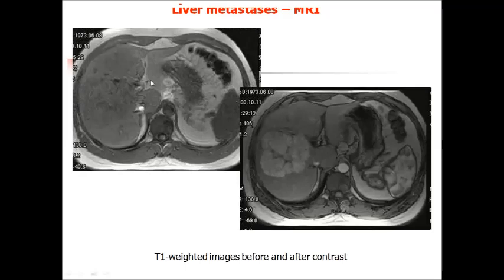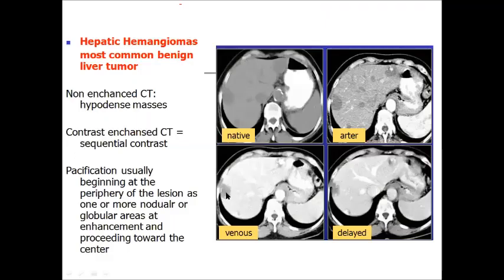You see that the MRI picture without enhancement shows us nothing special, but after gadolinium injection, enhancement of a huge lesion at the border of the left and right lobes becomes visible.